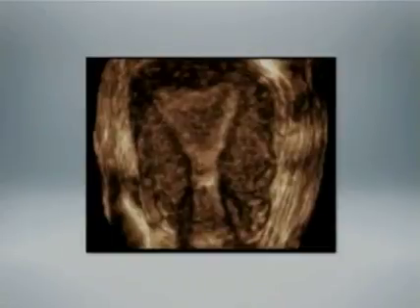The same is true to possibly a somewhat lesser extent in 3D ultrasound applications in gynecologic imaging, as in this coronal reconstruction of a uterus showing very clearly the endometrium and surrounding myometrium. In my practice at UAB, we do far less OB ultrasound than we used to.